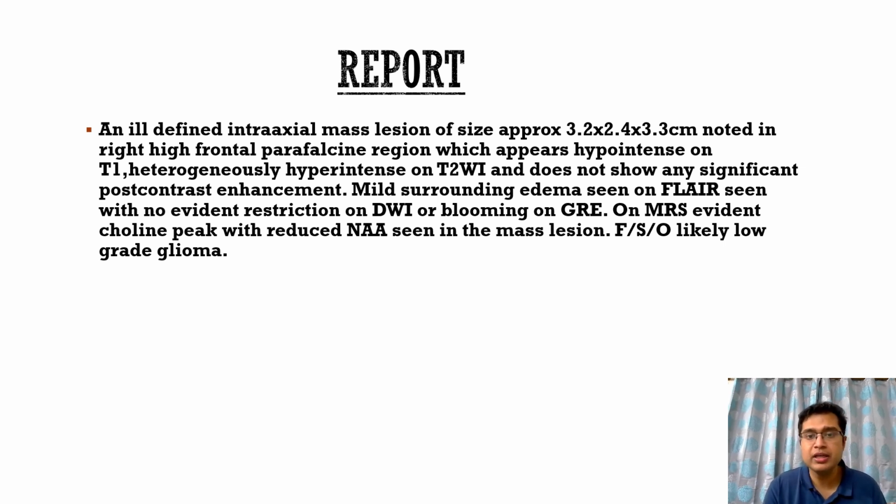This patient typically showed a neoplastic space occupying lesion along with a choline peak and reduced NAA. The diagnosis of a low-grade glioma was given.